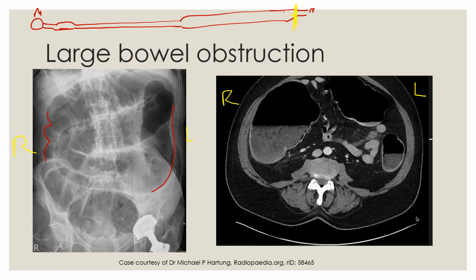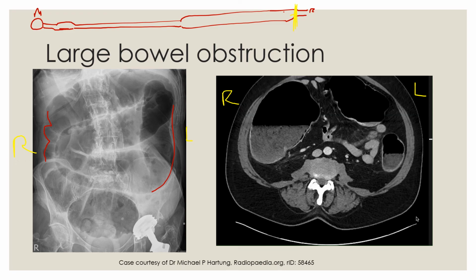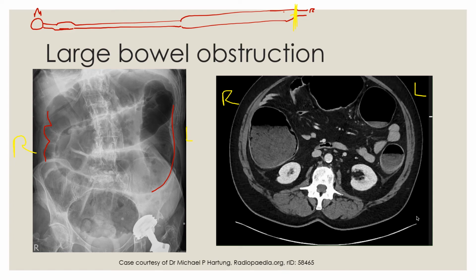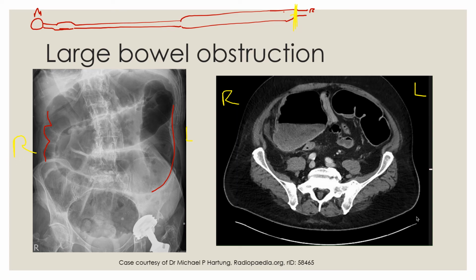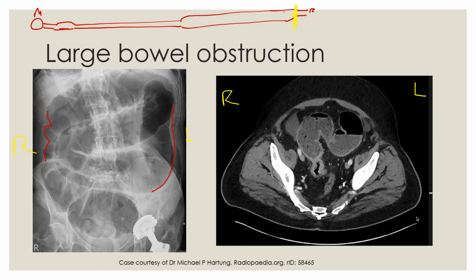So ascending colon, just right of the screen, just left of the screen and right of the patient, is our ascending colon. Just going down and then going up. Then we will hit our transverse colon here, and I'm going across, just follow that. We're going to hit our descending colon here. And I'm just going to follow the descending colon all the way down into the pelvis, and here we have what we remember as a transition point.